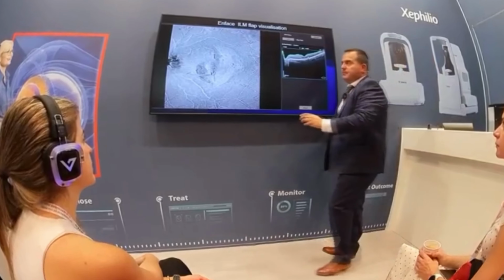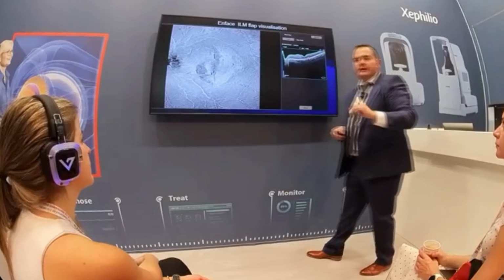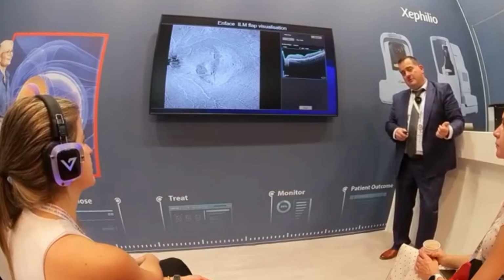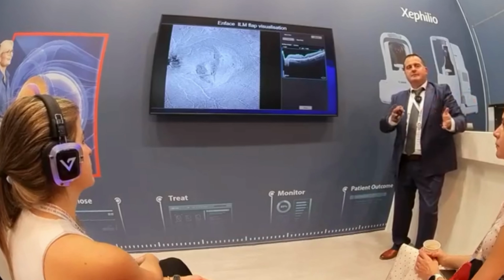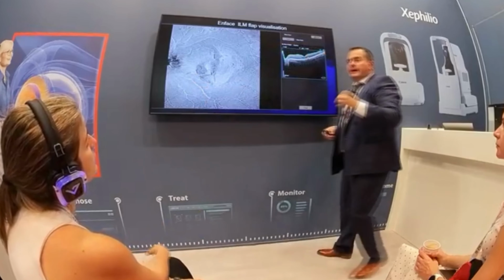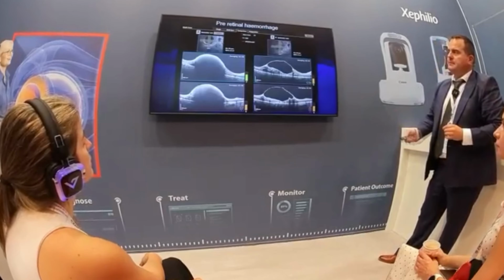And if we peel it here like we used to do, we induced an RNFL defect in the papillomacular bundle, which might explain suboptimal functional result after the surgery. So the macular hole is closed, but the vision is around 0.4. Why? Because we damaged the RNFL. So a lot of details can be precisely evaluated when you have good imaging.